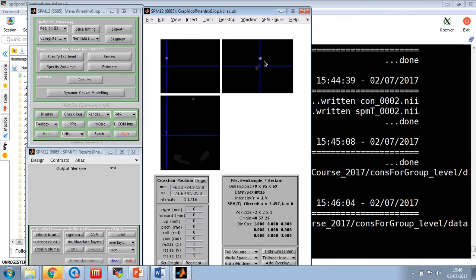Oh, there's only one image, but the ROIs are numbered differently depending on the region. So this one's 6 or 5. It's a bit hard to see actually on this one. So all of these blobs here are part of cluster 1. But there are some other clusters over here, like this one here, which is a value of 2.8 or something like that. They should be integers, but the numbers on the edges will be slightly different.